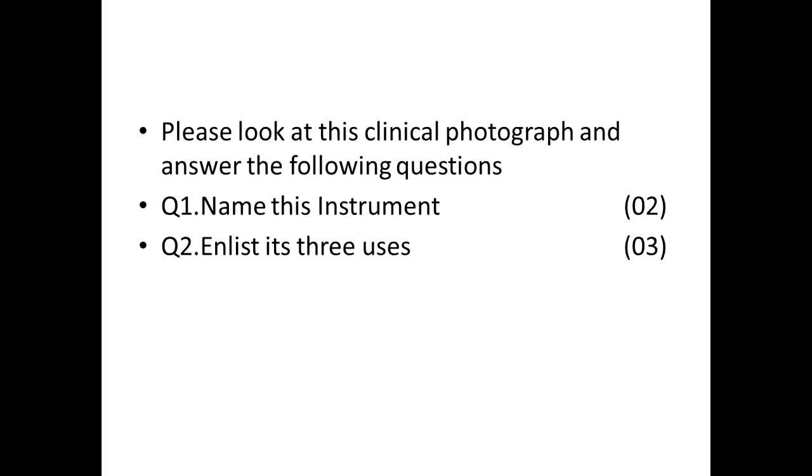This is endotracheal tube. So, what are its three uses? We used to give ventilation through it, we used to do tracheal suction through it, and we used to give medication through it.